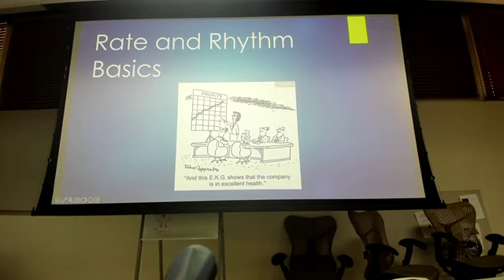Right? So today we start looking at the EKG itself and how we're going to read the EKG. The first thing we're talking about today is rate, and then we will go into rhythm basics, meaning every time after I look at my rate, how do I determine what the rhythm is? Okay, how do I determine what the rhythm is? It's easy, or for the most part fairly easy, to look at an EKG and say, well, that doesn't look right. That looks irregular. That R wave to that R wave to that R wave doesn't look right. That's fine, but we need to know way more than that. What about it isn't right, and what's causing it not to look right?